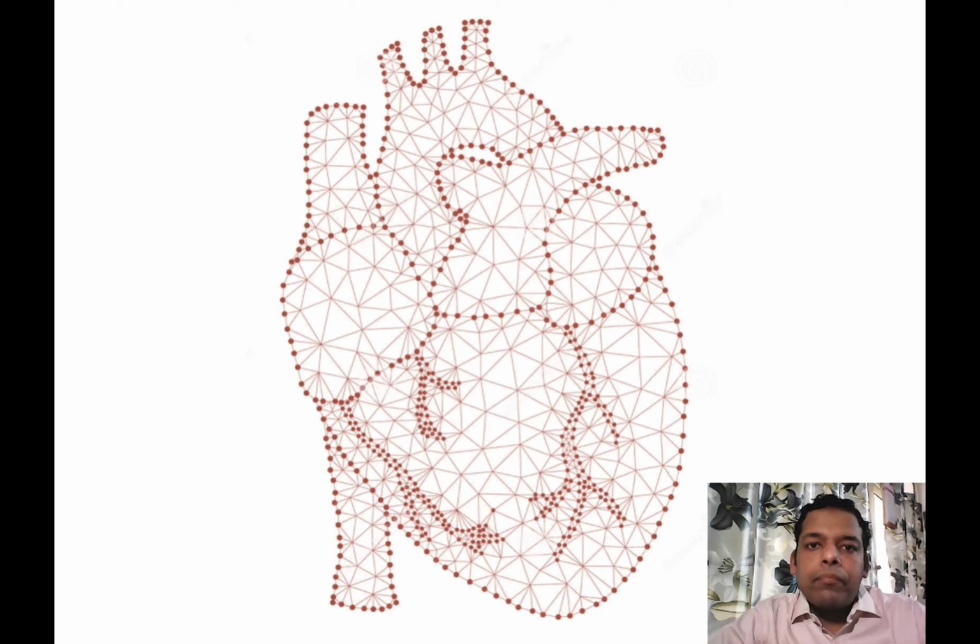Hello everyone. I am here now to connect the dots. We will now build upon our knowledge of ultrasound physics and echocardiography views to see a few pathological echocardiograms.